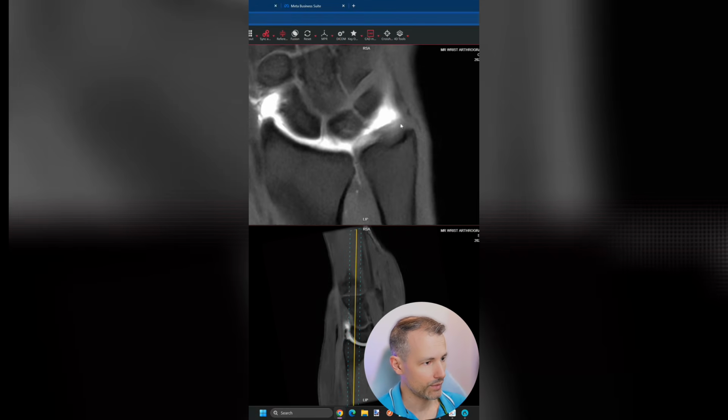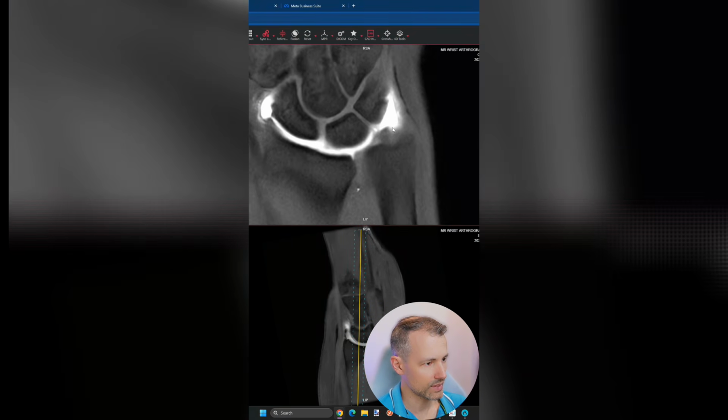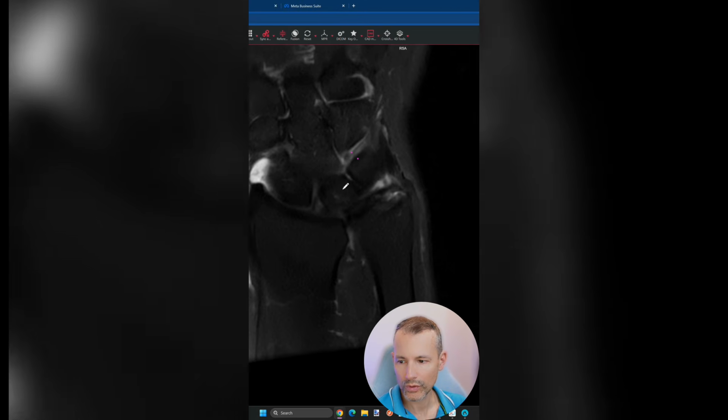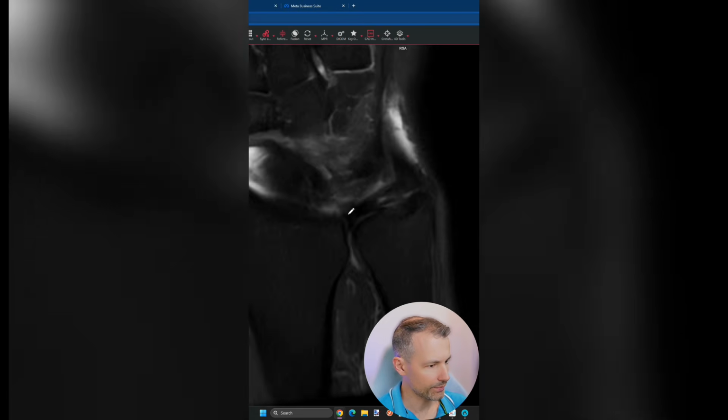And even at the periphery here, we can see the meniscus homologue outlined nicely and the pre-styloid recess here. And there's no contrast leaking into the attachments or anywhere else. So we have to rely really on the PD fat-saturated sequence here more for this case. And when we look here, again, we can confirm the disc is intact.